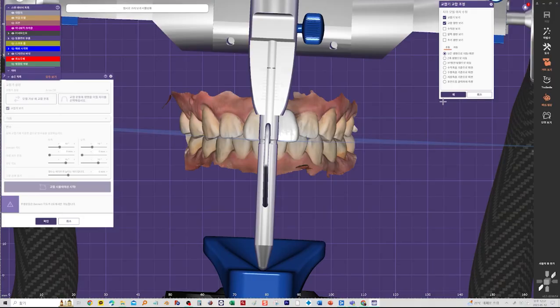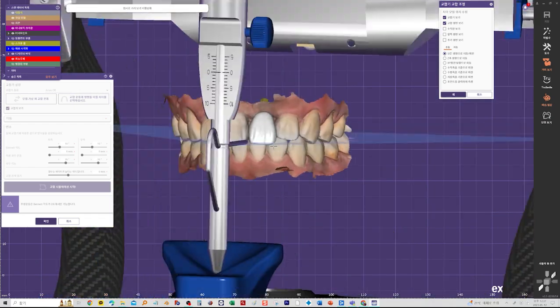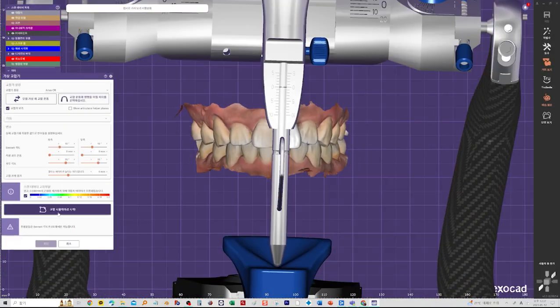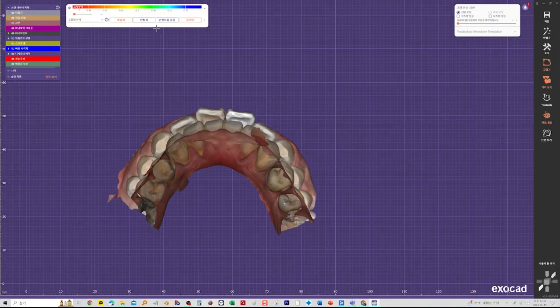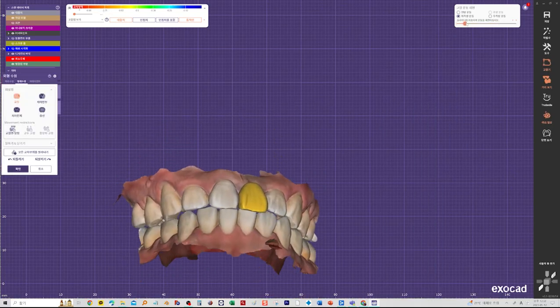We are using the articulator with the expectation that it will reduce the amount of occlusal adjustment. Let's see if it actually helps. The crown is machined in the usual way and mounted on the virtual articulator. The result is an occlusal adjustment to match the movement of the articulator.